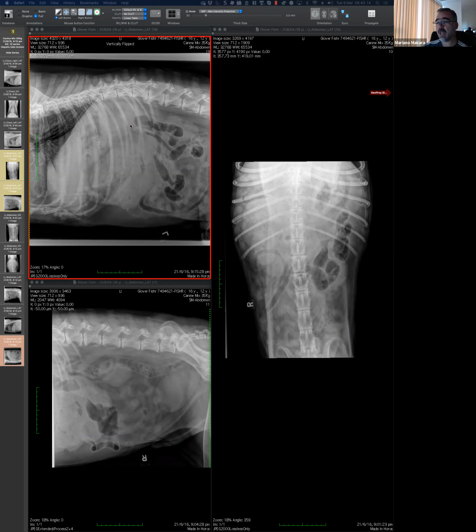And I'll give you the answer because it's a very uncommon thing. And I think we've done very well. I don't think there is any way to be sure about this differential diagnosis and to be able to say, I know it cannot be this, it cannot be that. Makes sense? So I don't think we can bring the list of differentials any shorter than we've done. But just for the interest of you, I'll give you the answer.